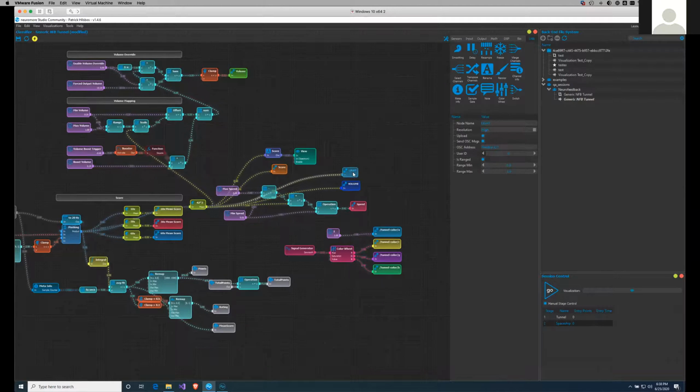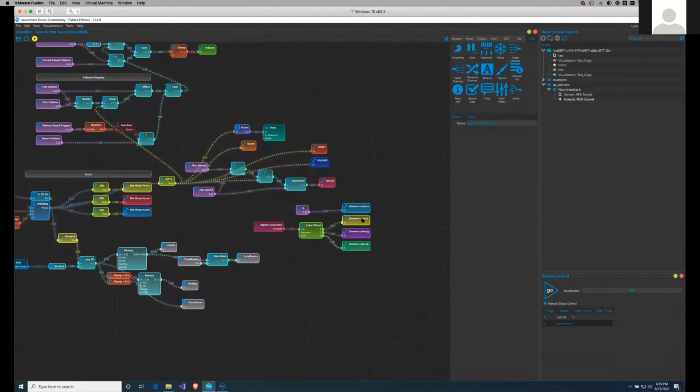What we did down here, we just added some OSC feedback. That particular feedback node transmits on OSC address /feedback/1. It also transmits /feedback/0. We output the speed, and as you can see here, that's /movement speed. That tells the visualization what the speed will be. And down here, you can see it's the generic neurofeedback tunnel experience, custom tailored for our infinite tunnel. So it also tells the tunnel some alpha channel. It's just a hard-coded one here.